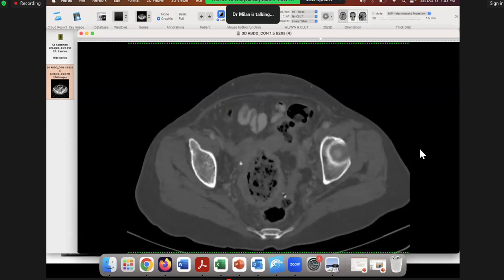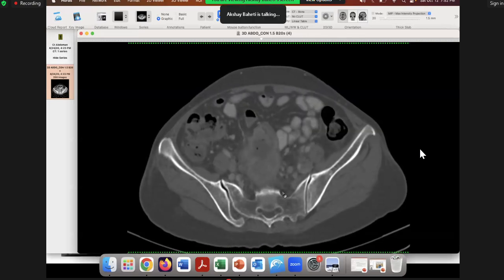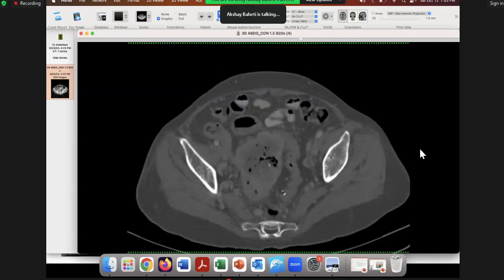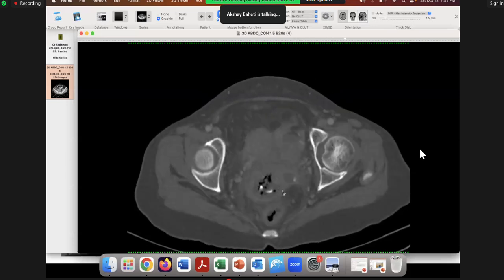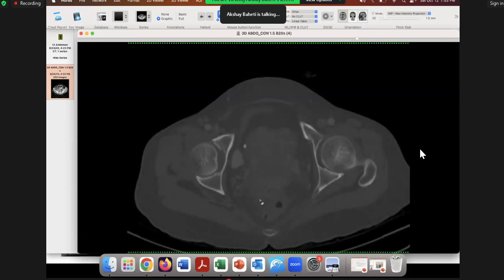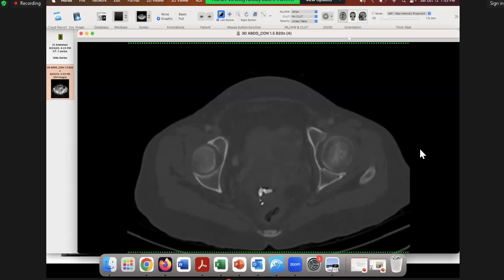Okay, what else do you see here? So there are calcifications within. Yeah, right. Calcification could be because of bowel content also. There's communication with bowel and maybe something hyperdense is calcified. But does this one look like calcium? What does it look like? Some ingested material?